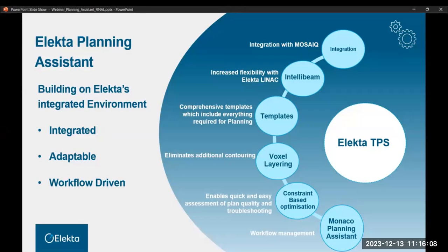As part of the Elekta planning system, we use the optimization method to crop away the constraint or the objective for your planning. That means you don't need to do any cropping of your contours at all, which can severely reduce the number of contours you need to begin radiotherapy planning and reduce any checking process.